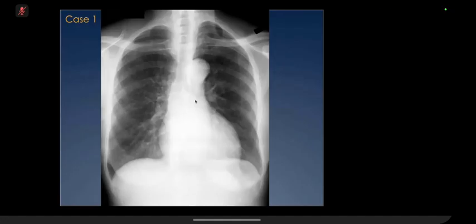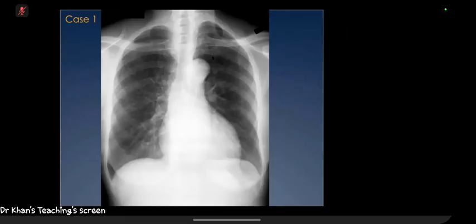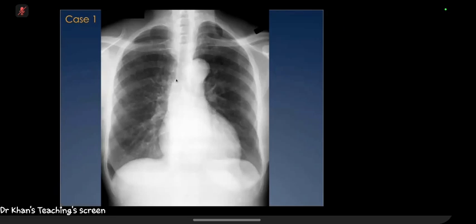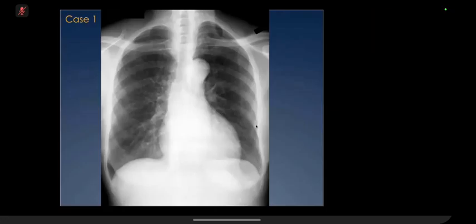So I wonder if there are miliary nodules. Very good. There are nodules. Why did you use the term miliary nodules? Because they are tiny. They are all of similar 1 or 2 millimeter size. They're all tiny. They're all discrete. And they're diffusely affecting the lung. Very good. So you can see them in the upper lung, some nodules in the upper lung, and nodules in the bases. Yes, they're spread everywhere, suggestive of miliary nodules.